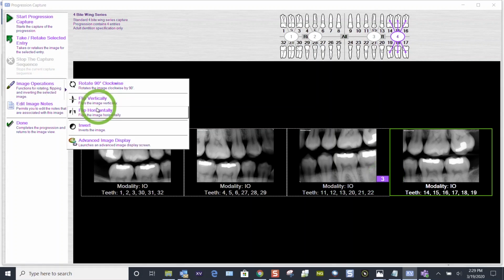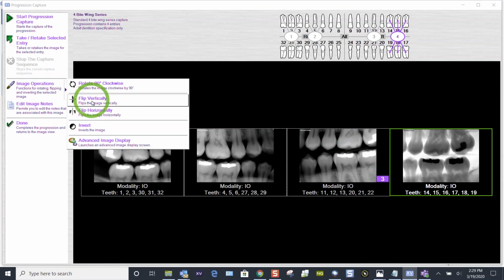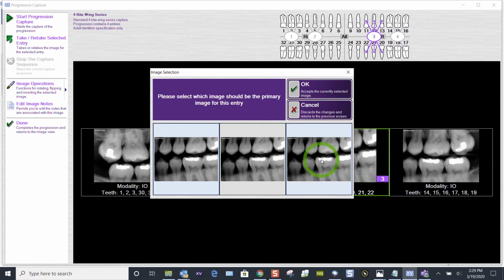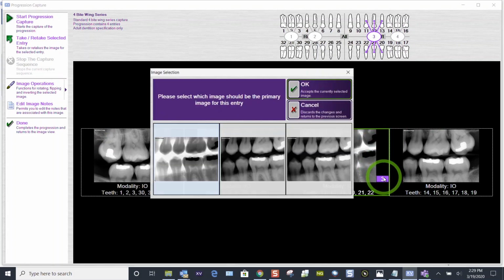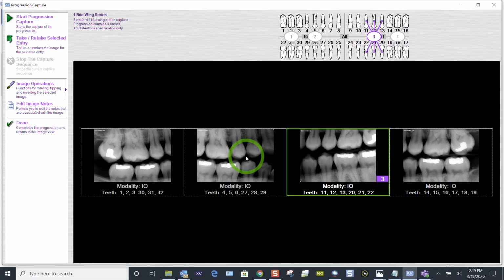Let's make one a little different. Images and invert. Well, let's not do that one. Click on tile number 3 and double click on the image that you prefer. That's how that works. These images will be stacked like a deck of cards. You're going to choose by clicking on that number, however many images are in that tile, double click on the image that you want to make it to the top of the stack. The software is not defaulted to where you can delete images, so they will all be there.